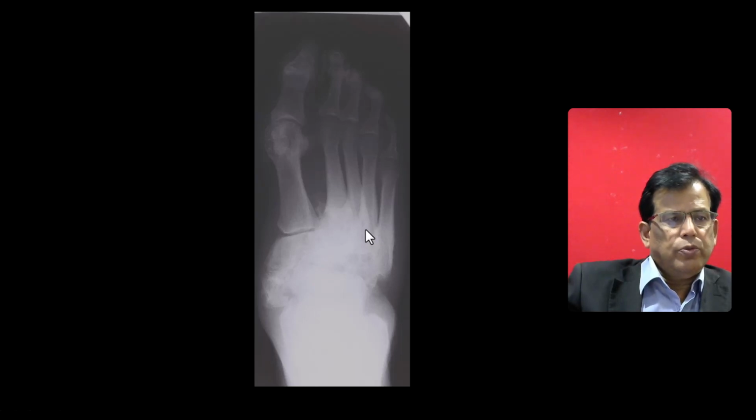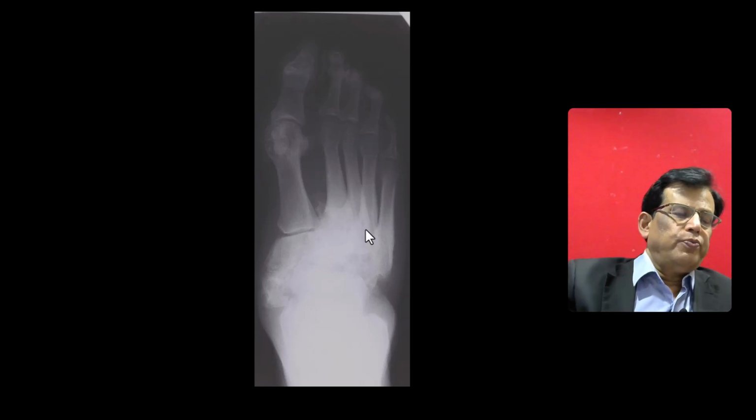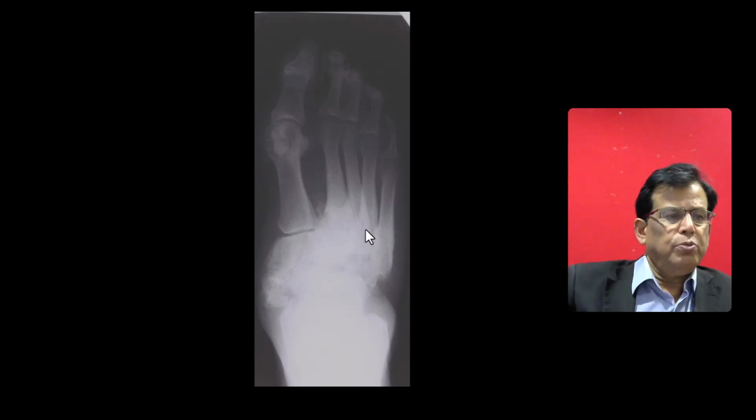Charcot joint. Okay. What are the typical features of Charcot joint? So there are two types, it could be atrophic and hypertrophic form. In the hypertrophic form, you see the most common 5 Ds: density, disorganization, and so on. What is the most common cause of Charcot nowadays? Diabetes. Is there any evidence here?